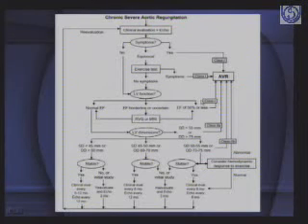So 2 or 3 things come out from this algorithm, that you need to know the size of the LV, not only just the jet of the aortic regurgitation, not just the vena contracta, but you need to know LV size. And I still think that a good M-mode echocardiographic cut of the LV in parasternal long axis view gives you a fairly good idea, a very accurate idea of LV dimension, and therefore you can keep that in mind, whether it is more than 55 millimeters systolic dimension. What do you say? I think that will give us a very good idea. So this is an algorithm for when to think the patient should go for surgery.